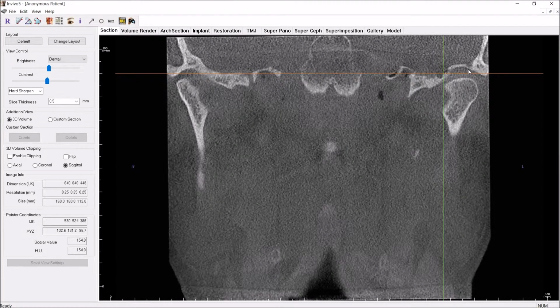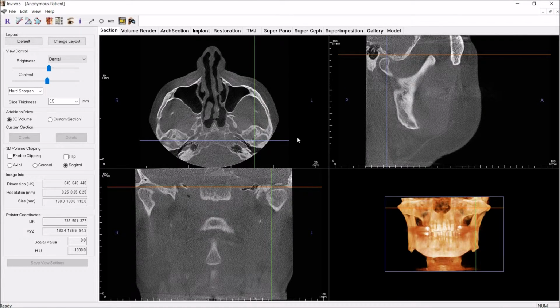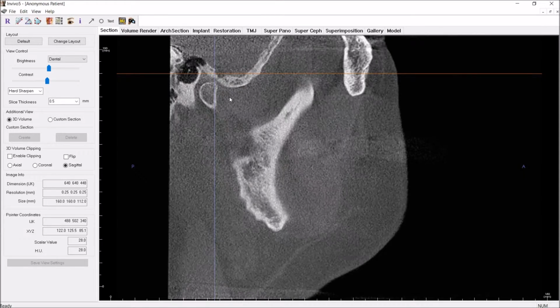And so you'll see that in various areas. It's something to remark on, something to comment about, but just the way it looks, it's pretty distinct the way the borders look. We can be sure that that's all that it is, and it's nothing to worry about. If it were coming from the other side, from within the glenoid fossa, then you might start thinking about osteoarthritis. And maybe I'll talk about that real briefly.